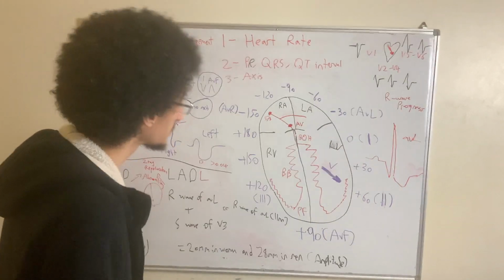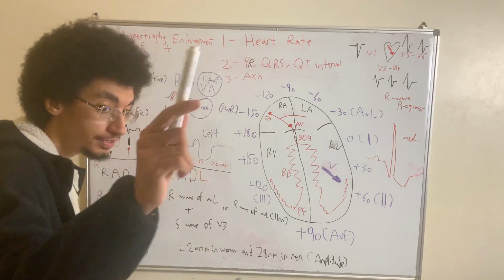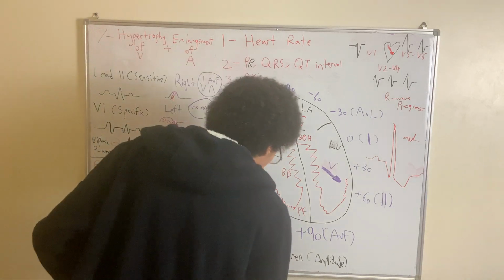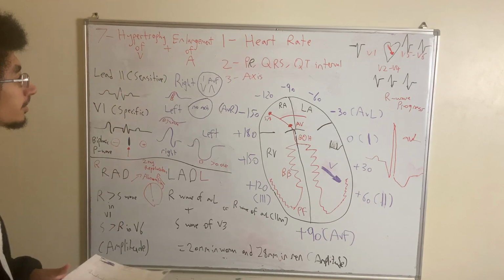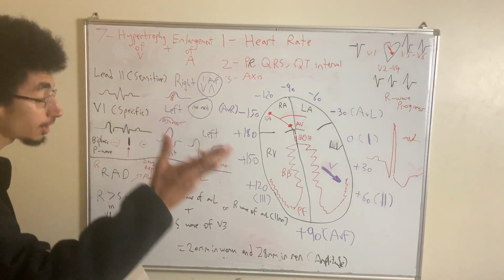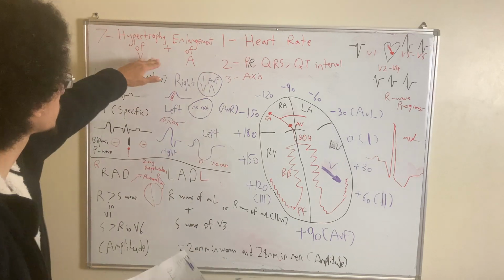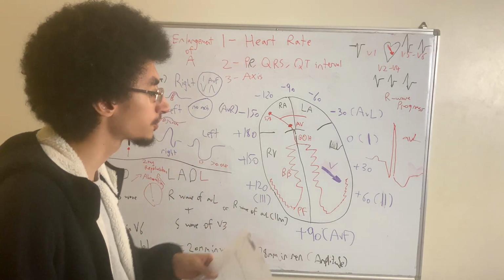The repolarization is affected. And now we have officially finished the first abnormality. You may now check any EKG for any hypertrophy and especially any enlargement regarding the atrium, which is step number 7. And this is the one that we started with. For the next upcoming videos, we will be systematic. We would like to start with this one because it will implement what we've learned in the previous 2 videos.